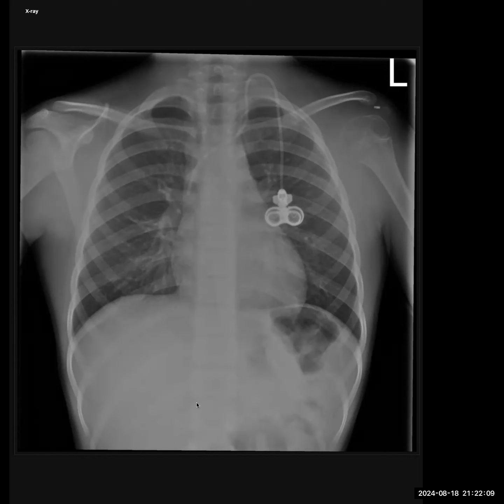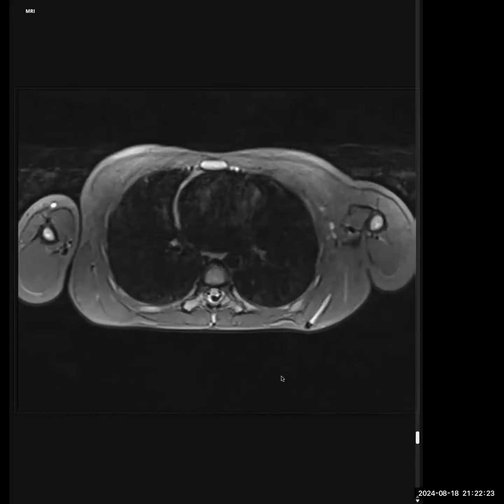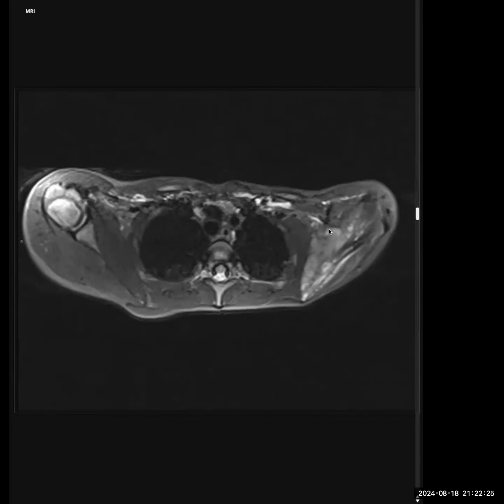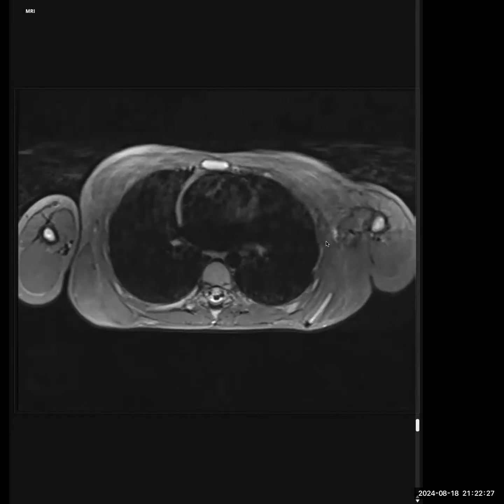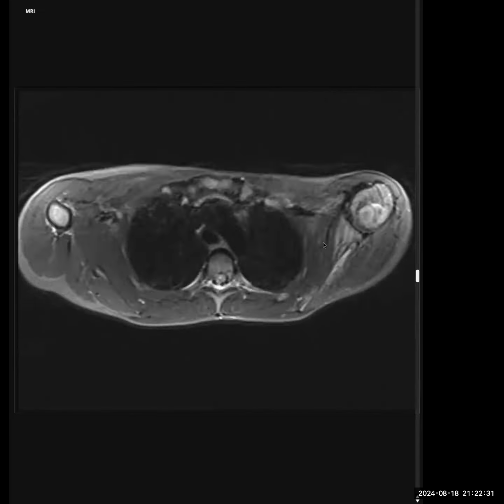Very well done. I've given you a 7 in this. Yes, you described this pathology. You described the soft tissue lesion, the permeated destructive appearance of the upper part of the left scapula. And then this showed the same thing. And you've already described your differentials, which was Ewing's sarcoma or osteosarcoma, you described both.